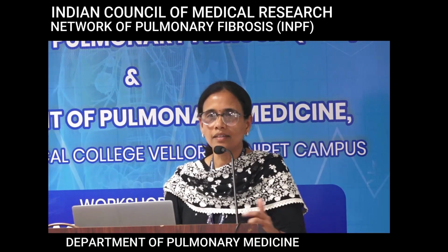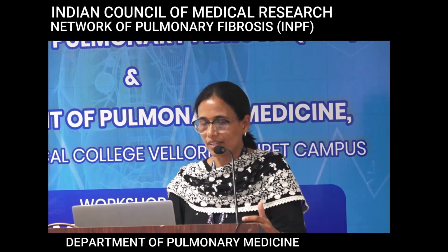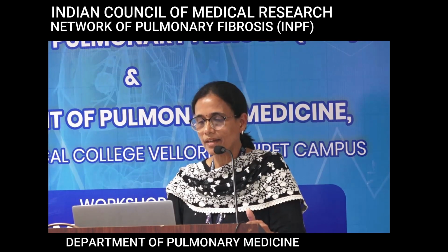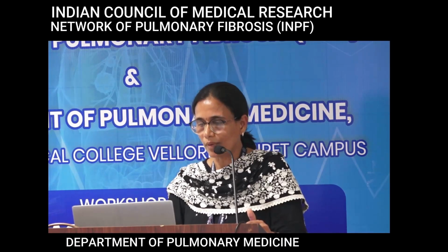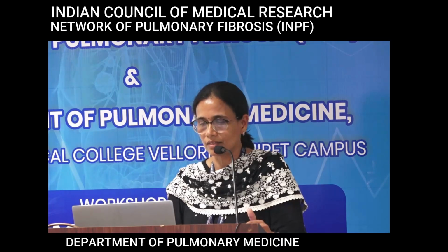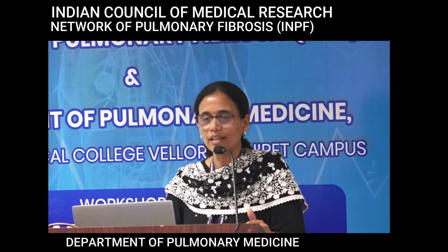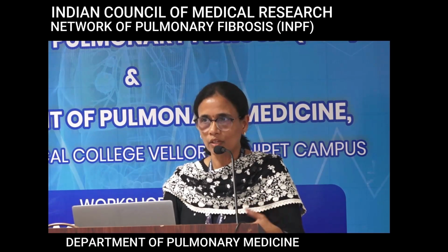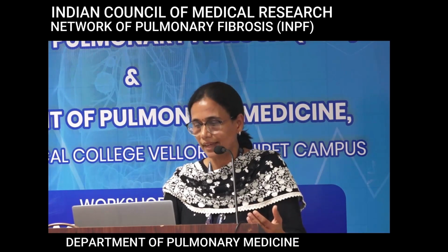So basically another importance of radiology is to follow up these patients and see whether there is any worsening of the fibrosis over time, or they can develop acute exacerbations. So we can see that the fibrosis has also mildly increased with larger size of the cyst, and we can see that there is development of ground glass densities, which could be due to an acute exacerbation. So there are diagnostic criteria set up. So basically newer radiology, when we rule out other causes like infections.